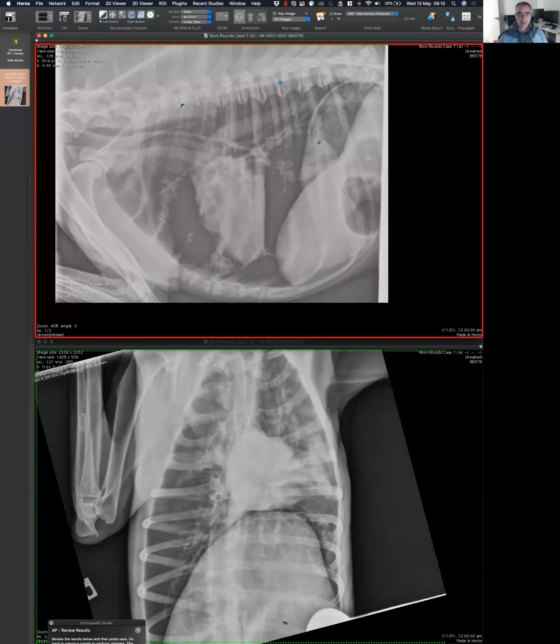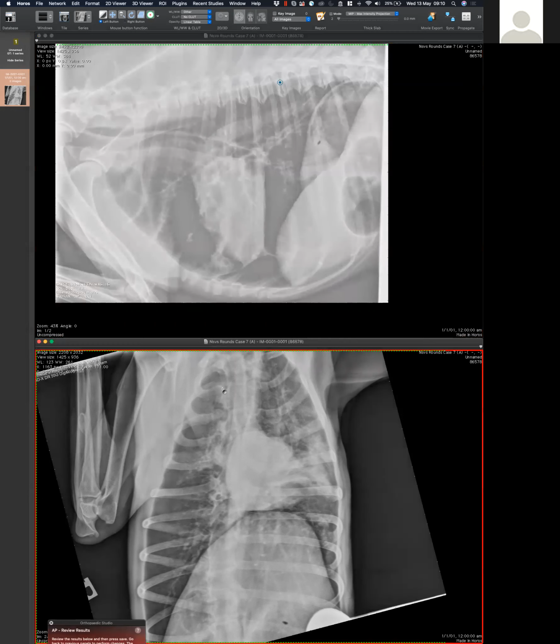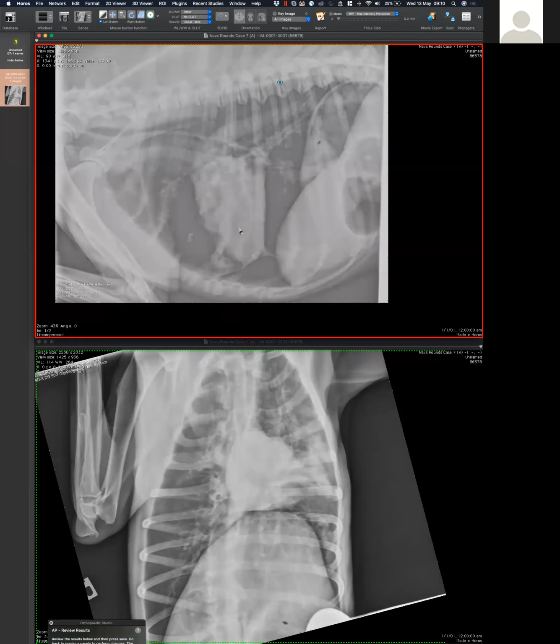Anything else? It's interesting to me that on the Zoom, the image is overexposed and really makes the changes in the lung fields jump out at me that I didn't really notice when I looked at it on Keystone. It was like changing the contrast settings. It really made the lung fields jump out more when the exposure was abnormal and poor, but it really made it obvious.